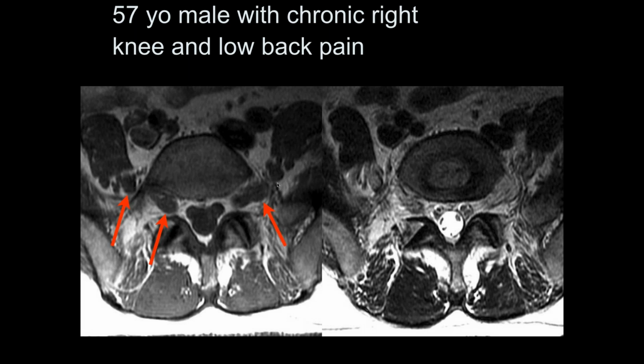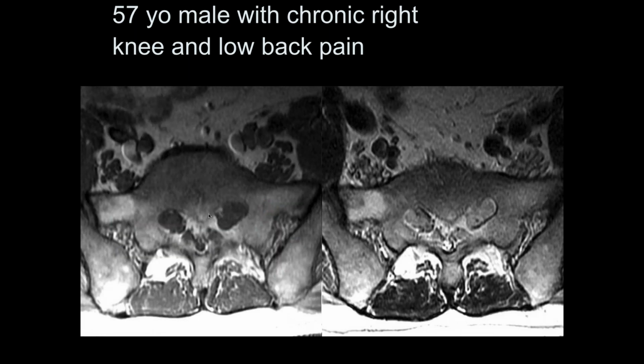They're thickened outside. These are probably a little bit thickened too, but that's very thick. So maybe another Charcot-Marie-Tooth situation. All these out here are very thick. Inside, higher up, they were pretty normal. Look at the sacral roots here, markedly thick.